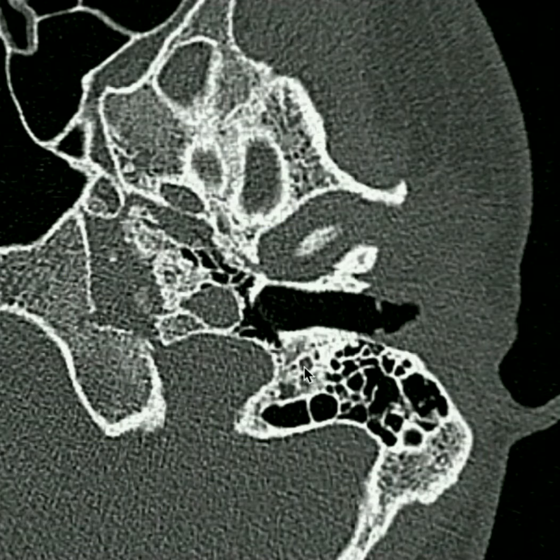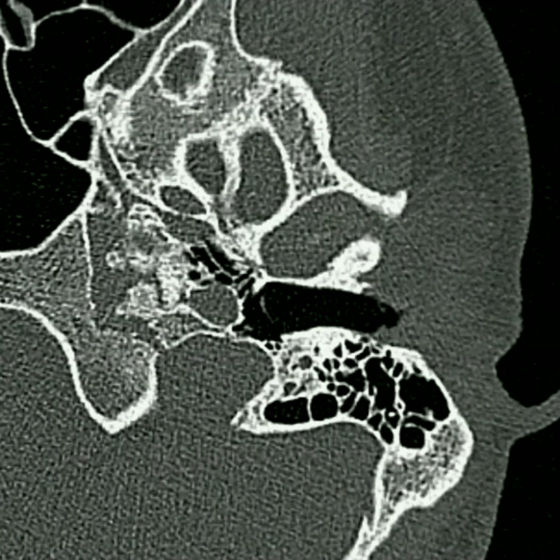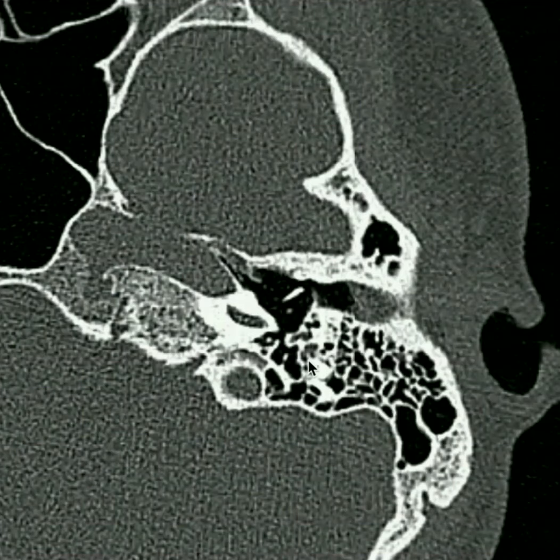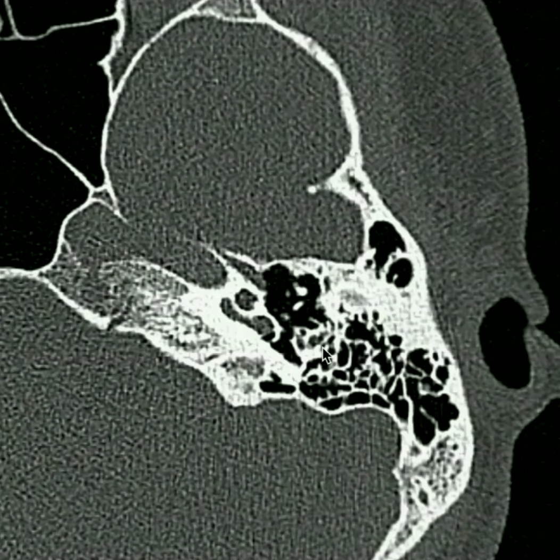This is the mastoid segment of the facial nerve right here. As we scroll further superiorly, we'll notice the full extent of this mastoid segment of the facial nerve. And up here is where it is the tympanic segment. So this posterior genu part, where it bends downward, is where the mastoid segment of the facial nerve begins. So we're going to look very carefully along the medial aspect of this to find the origin of the mastoid canaliculus. So I'm going to scroll down again.